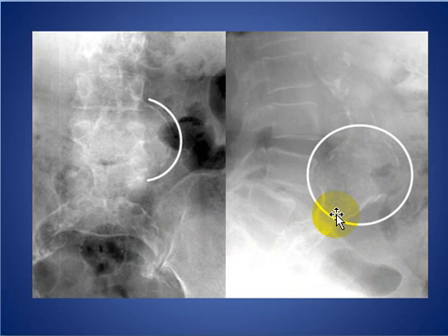For better evaluation of the aneurysm, we need CT and MRI, and ultrasound also may be helpful. What else do we see on this lateral X-ray? We see there is a spondylolisthesis of L3 over L4 with decreased disc space. Also, we have seen the calcification of the common iliac vessels with ectatic changes more on the right side.